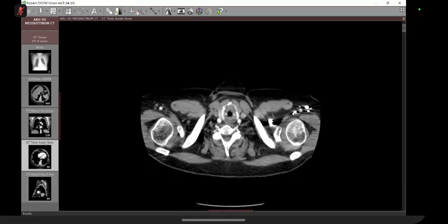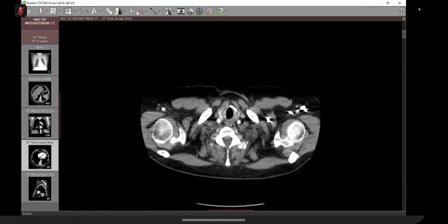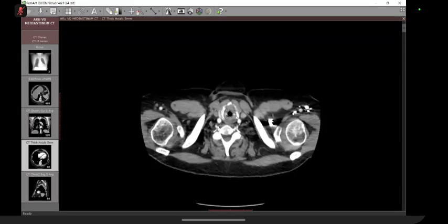Here, this is only one CT of the chest which you have got in your workshop. And this one is to concentrate on Mr. Esophagus. So we are at the neck. You can see these cartilages. Please remember that the laryngeal cartilages, as we age, become more and more calcified. Even in the last case, the neck case, it was not like this. Now it is very calcified. So that is normal, right?